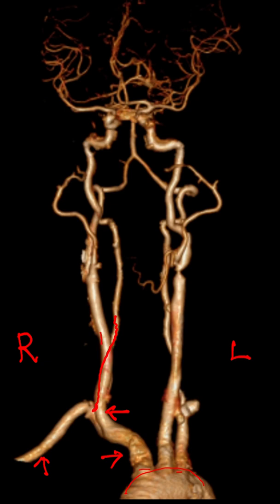So now you can trace the right. As we discussed earlier, the dictum is you trace one vessel at a time. Then it will be easier to identify the vessel, because this is a 2D picture. Vessels will be overlapping. This vertebral artery is lying far behind, but it is overlapping exactly on this. So you might confuse one vessel for the other. So the main dictum is you follow one vessel at a time. Now we will trace the right common carotid artery. This is the common carotid artery.